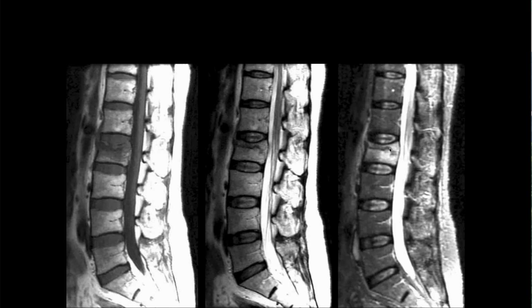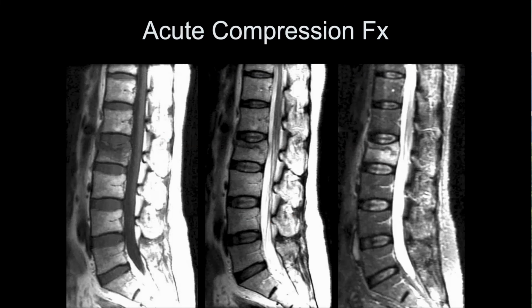And you won't see these fracture lines as sharply because you have infiltration among all of the trabecular bone here, and you get less sharp delineation. So this was treated as just a compression fracture. So it's treated conservatively.